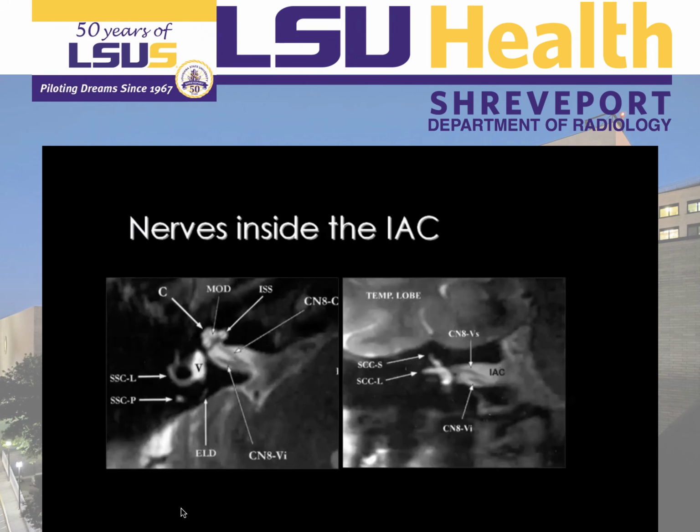The membranous labyrinth you're only going to see in the MRI, which is good to see soft tissue. It's exactly like the bony portion, but this is where the real structures are working together to make us listen to things.